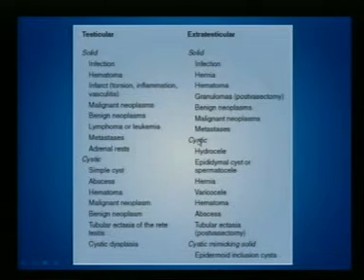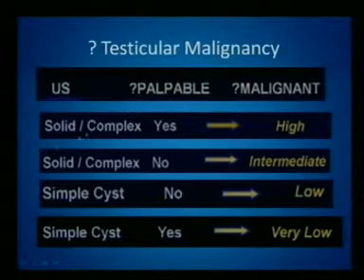Scrotal masses can be extratesticular or testicular in origin. Testicular in origin can be solid and can be cystic. I will try to go over some of these lesions.